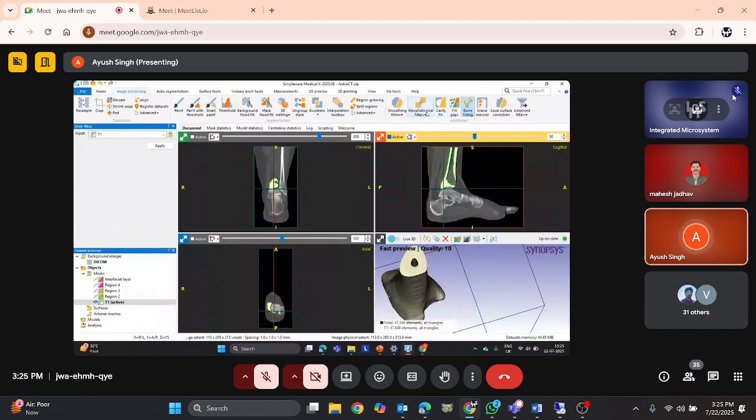Cavity fill will only fill the cavities that are smaller in value, that have a voxel count, that is volume pixel count, of around 27 voxel units. But bone fill will work on the entire structure and solidify the whole in a single operation. We just need to click apply and the process gets started. It will take some amount of time, around 1 minute, for the solidification. When the solidification is done, we can cross verify the result in both the 3D view as well as in the 2D view.